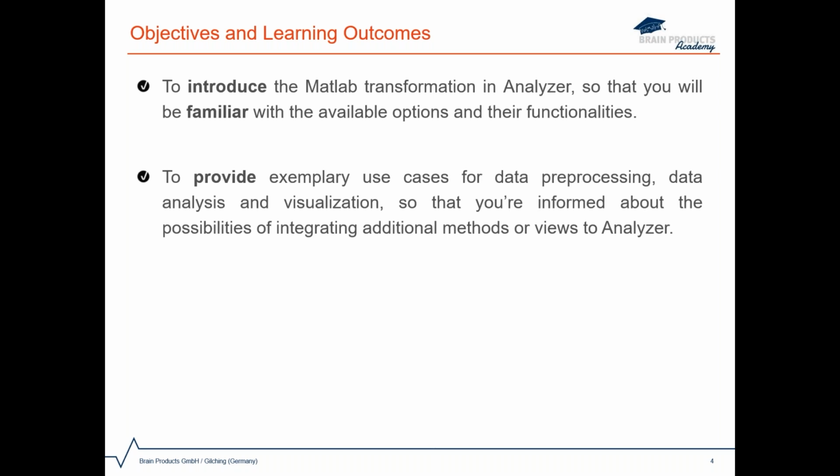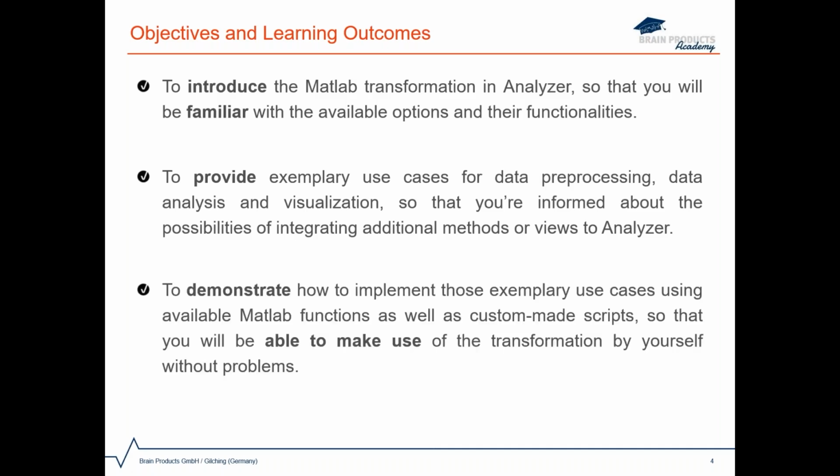We will provide exemplary use cases that cover pre-processing, data analysis, and visualization purposes so that you are well informed about the possibilities of integrating additional methods or views into Analyzer. Lastly, by demonstrating how to implement those exemplary use cases using various Matlab functions as well as custom-made scripts, hopefully you will be able to make use of the transformation by yourself without problems.